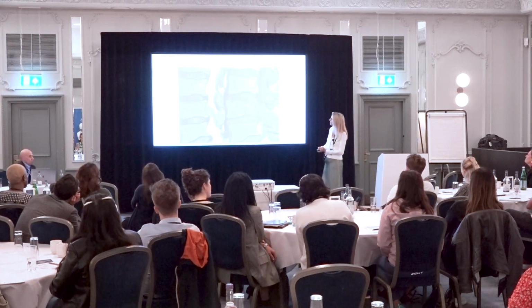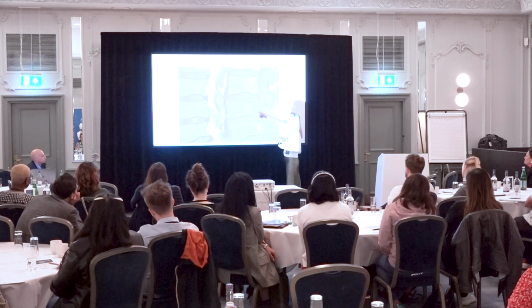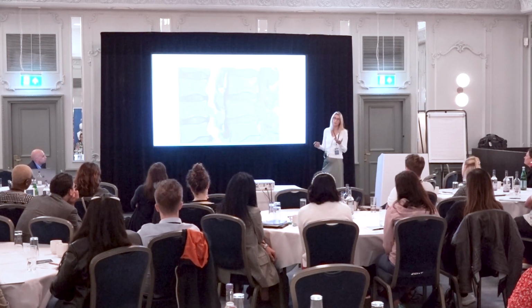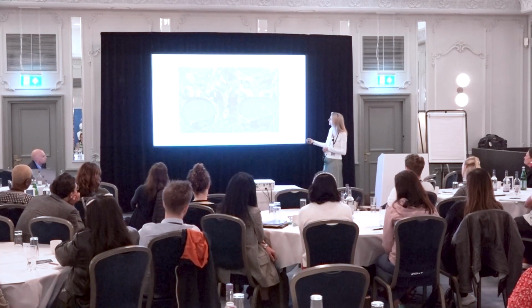Now, just to show that sometimes patients will come to our MDTs. They've been seen in a district general hospital, that they see something and they think, is this a disc, is this a tumour? So this was referred to our MDT, this is quite a while ago, and the question was, is this a tumour? And you can see here, there's a soft tissue mass behind the vertebral body, and it comes laterally and fills the foramen. And it was thought to be a schwannoma, or neurofibroma schwannoma. And so we looked at it and we thought, no, we think this is a disc.